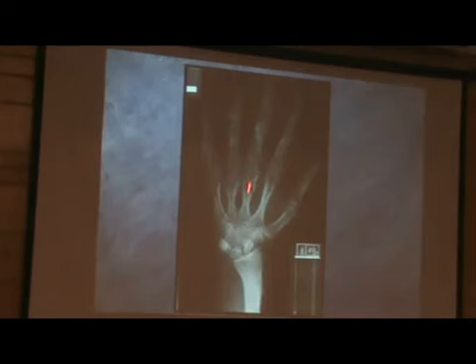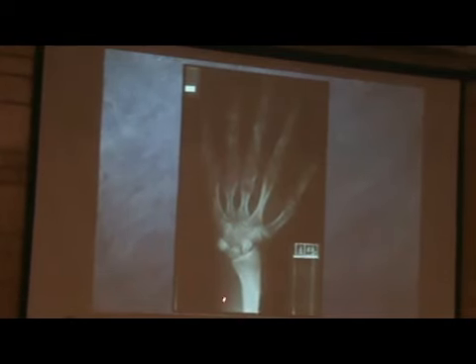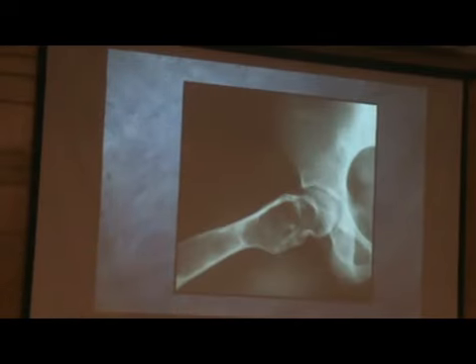Another patient here with multiple chondromas. The patient had resection of the distal ulna for possibility of malignant transformation. The patient also has these little calcifications. Here you can see some phleboliths. This is a patient with Maffucci's. We have multiple chondromas and hemangioma in the same patient.